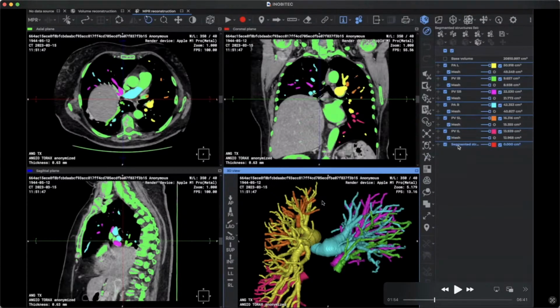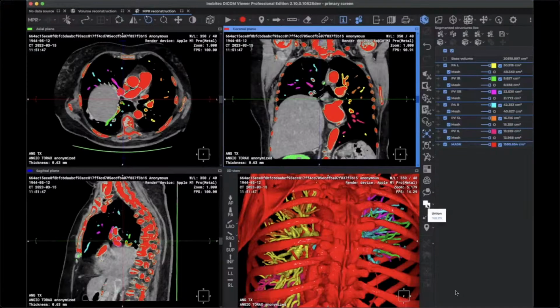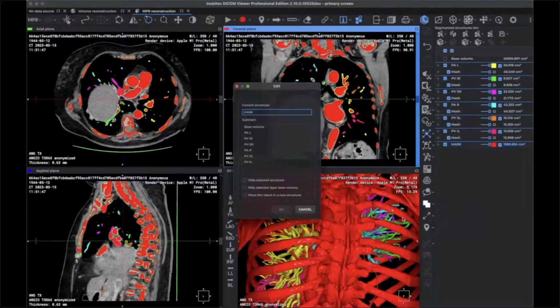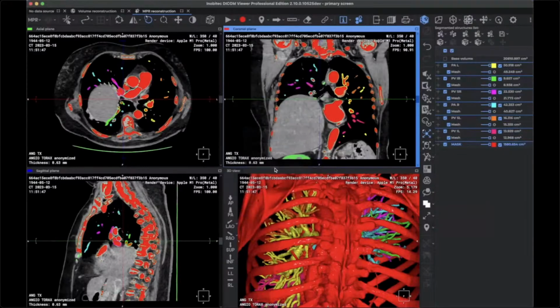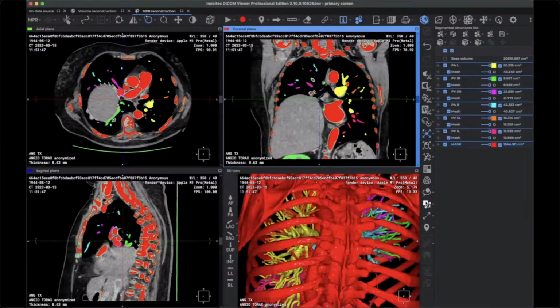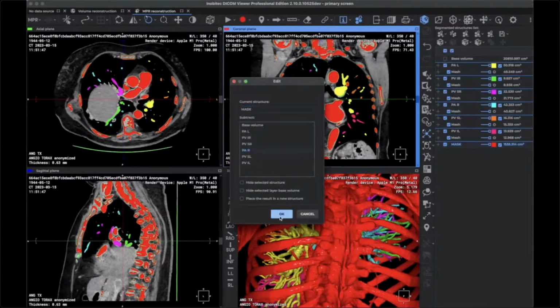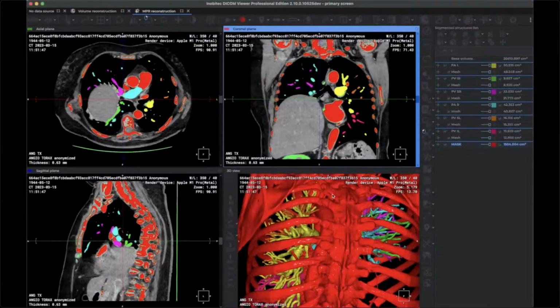So what I'm going to do now is put them back in the final image. I'm creating the masks to isolate them and to isolate also the bone structures. I'm going to subtract my mask from all the structures I have already segmented, because they don't interest me anymore. They are already isolated. I don't need to work with them anymore. So I subtract my mask from all those structures.